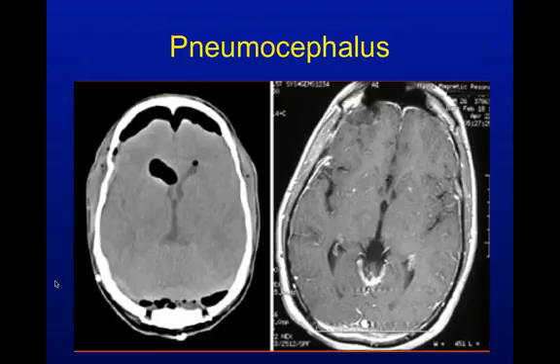Pneumocephalus, maybe the patient's complaining of lightheadedness. Maybe a traumatic incident, or maybe they had a lumbar puncture done using air as a contrast instead of some other contrast medium. Plenty of headache.